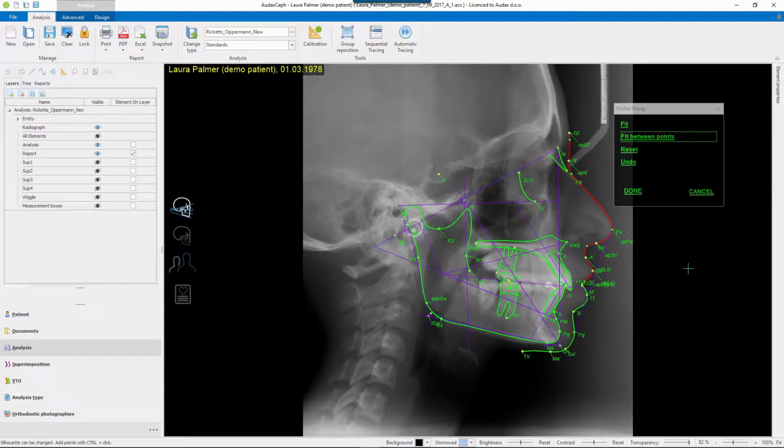In most occasions this will not be needed, because the software will automatically find the right silhouette, and no manual tracing, nothing will be needed. So this will be in 95% of radiographs done with those state-of-the-art X-ray machines that are today available.